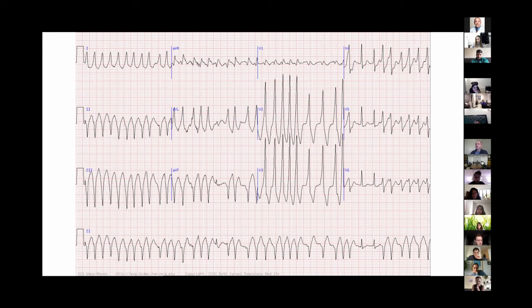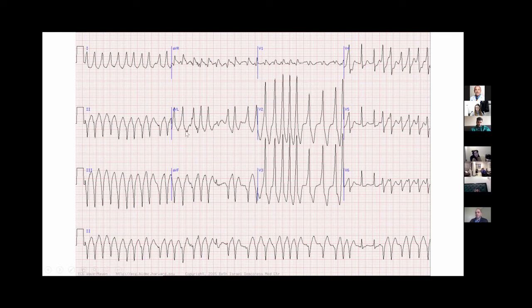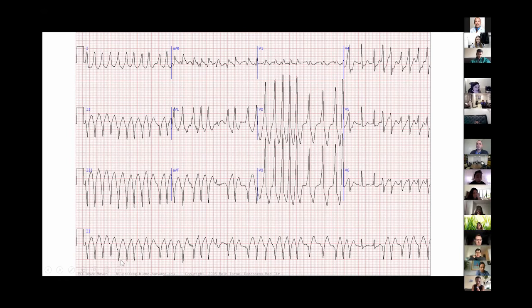Yeah. Okay. So I'll help you out with this one. So this is really going to be, as you move on, and I know since you want to go into cardiology, more of a pattern recognition EKG. It's very classic, and it's rare. So this is the pre-excited AFib. What's happening here is this person has an accessory pathway and has atrial fibrillation. And you see how the heart rate is extremely rapid. This is highly unusual to have such a rapid heart rate.